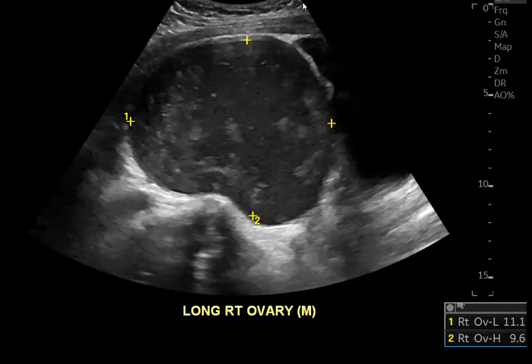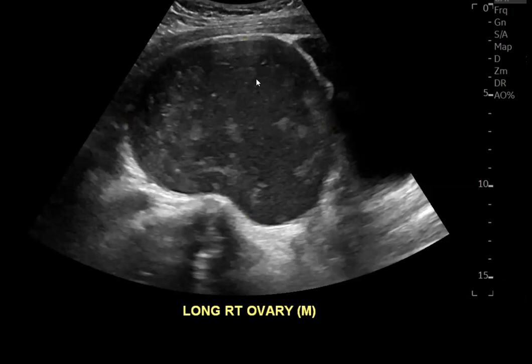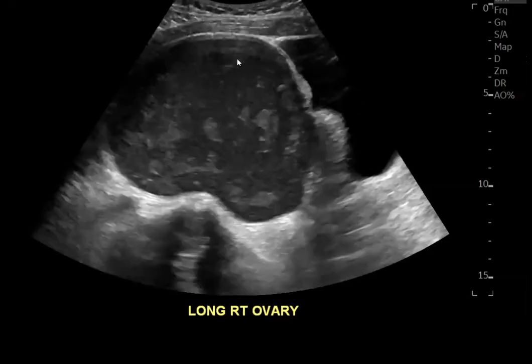I don't have. Oh, wow. Cool. I've only seen the classic ones, I always describe them as homogeneous low level echoes, which I feel like in between there are, but I did not know what these echogenic areas were. Yeah. I'm seeing them floating in the middle for the first time, but I've seen multiple where these are nodular and along the wall. And whenever I've tried to look for an explanation, I've seen multiple areas where they say these are cholesterol deposits, which can look echogenic along the walls. So just a cool fact.